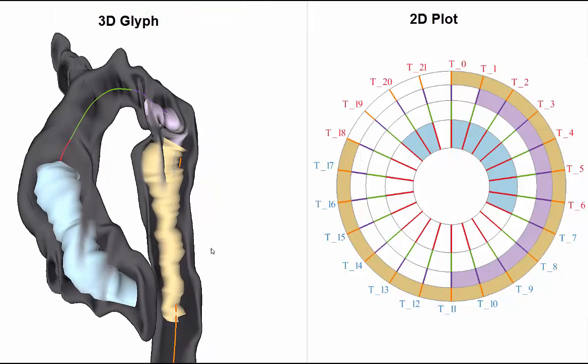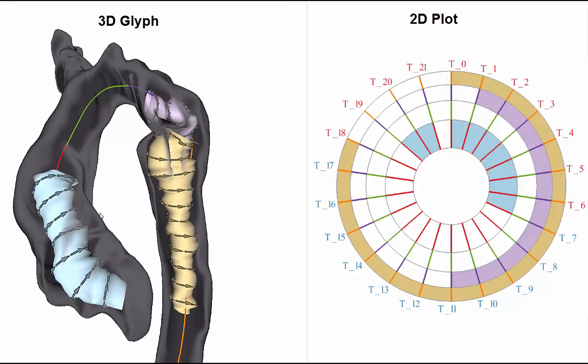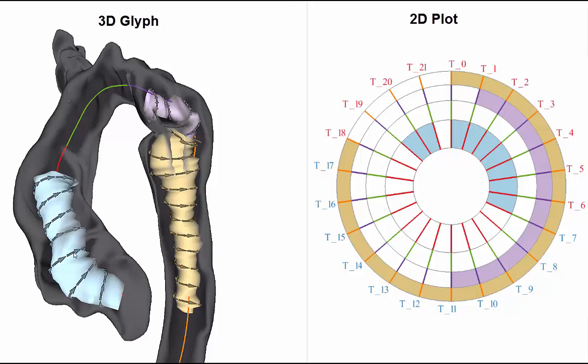The rotation direction is depicted by arrows on a quad strip around the surface. For a right-handed vortex, such as the blue one, the arrows point in flow direction to the upper right.